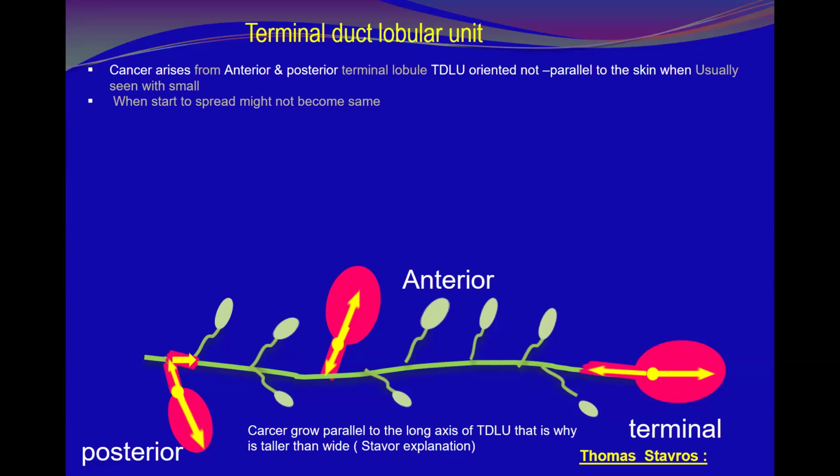In the anterior and posterior, the mass is not parallel in orientation. Excellent.